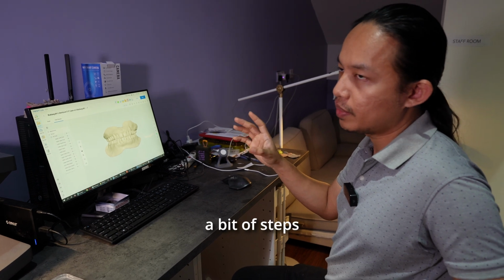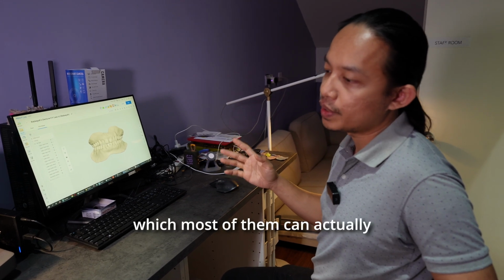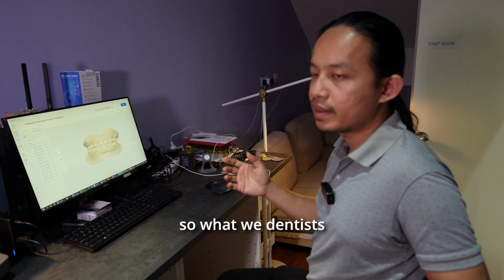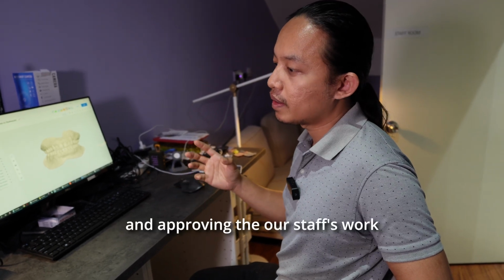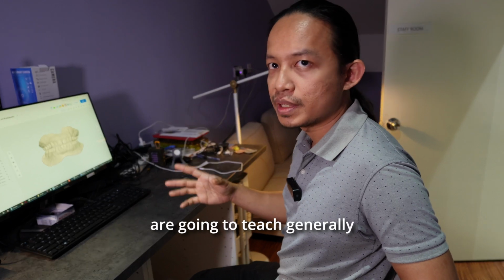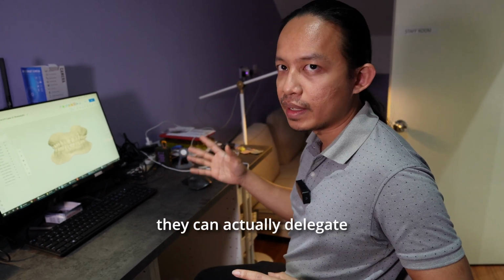There are quite a few steps that you need to know. It's not difficult. It's quite simple, and most of them can actually be delegated to staff. So what we dentists actually need to do is just the designing, the placement of the teeth, and approving our staff's work. So that's what we are going to teach. Generally, we want the dentist to know all the steps, and afterwards they can delegate them to the staff.